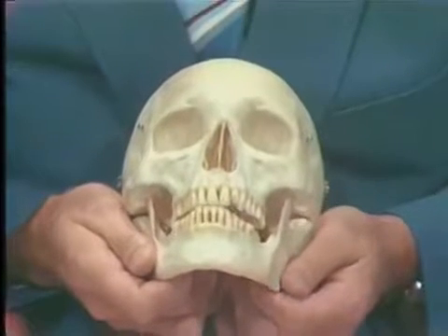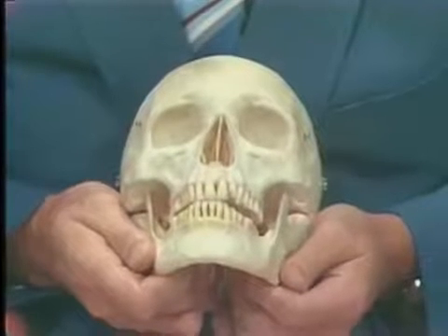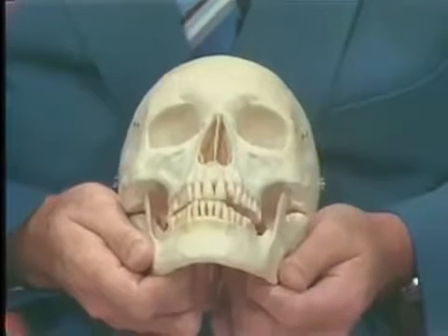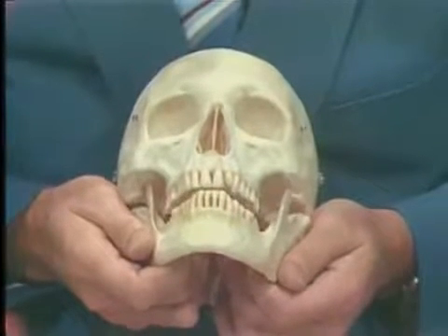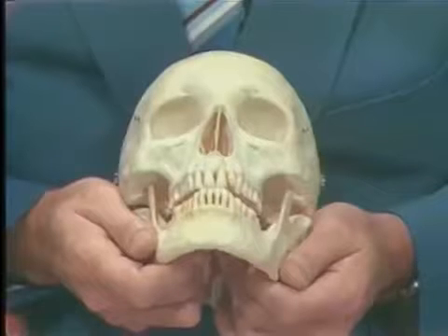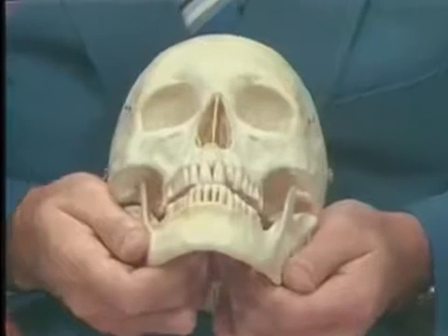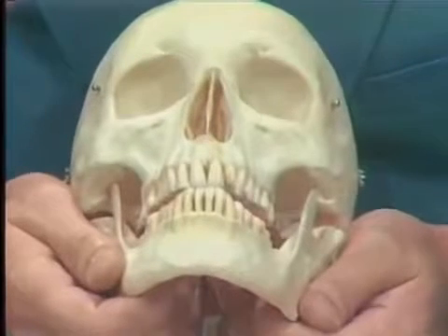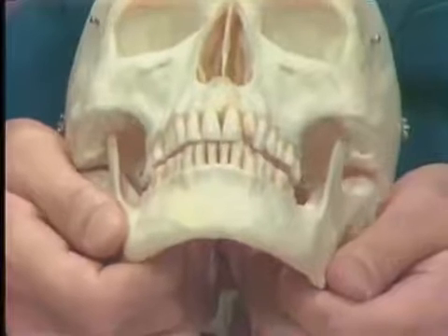See, so you notice on the side that's a working side, you have contact between the teeth, and on the side referred to as a balancing side, there is no contact on the teeth. The other movement then is protrusive, and when you come anteriorly forward with the mandible, straight forward, you would find the anterior teeth contact, and there's no contact in the posterior area unless there are interferences present.